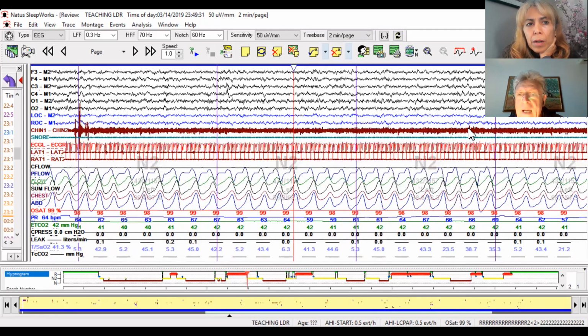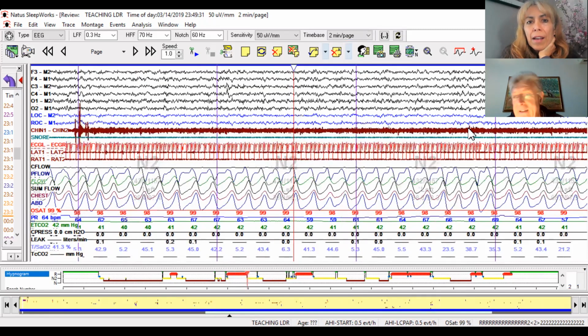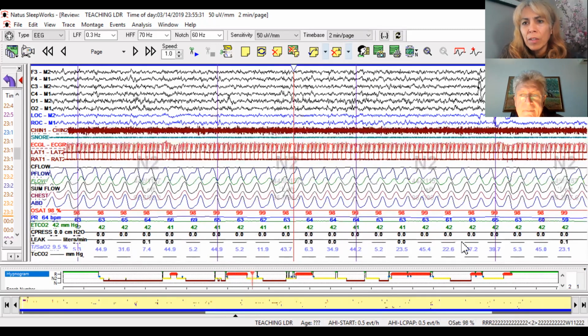And then one more example, and then I think for today, I think things are quite clear. I think we've covered a lot. I think we could stop actually, because now we're changing to N2 and we've already done some scoring in N2. Yeah. Good.